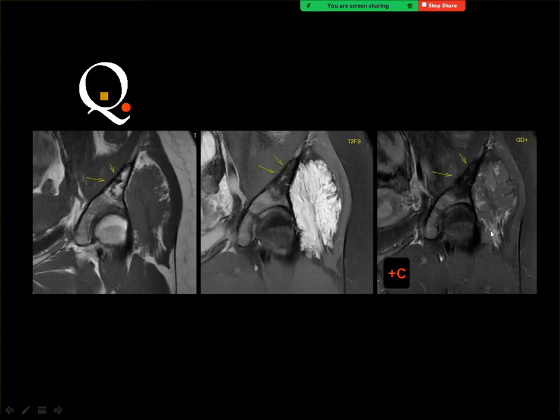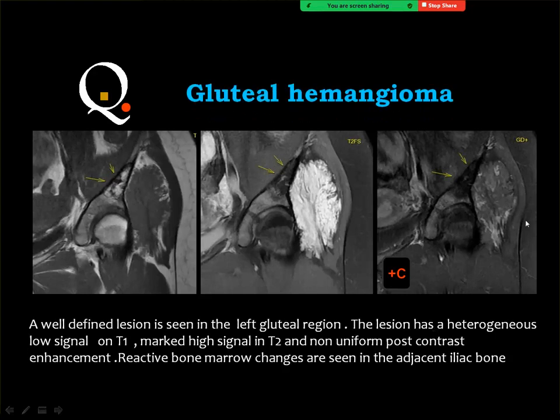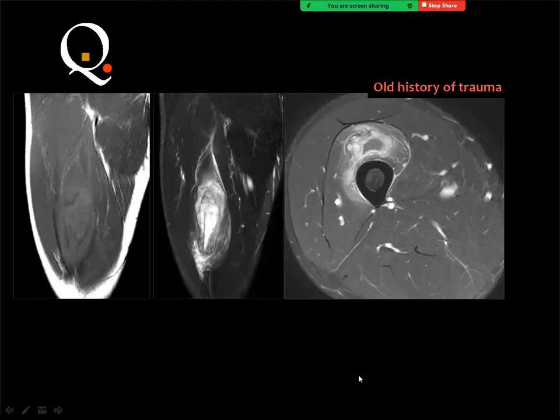And hemangioma is enhanced actually, and you don't expect an extensive or very prominent enhancement in the hemangioma arising within the soft tissues of the extremities. The hemangioma which enhances very strongly is that in the head and neck, especially in the parotid. But the musculoskeletal hemangiomas, this is usually the pattern of enhancement, whether it is intra-articular or within the soft tissues of the limbs.